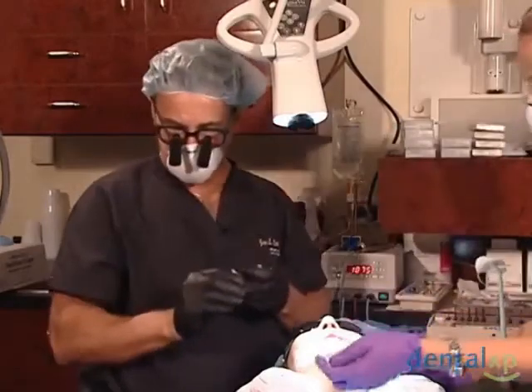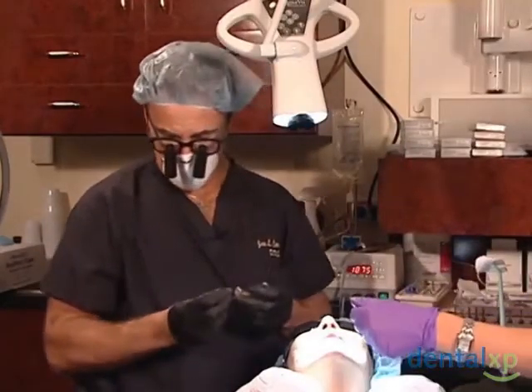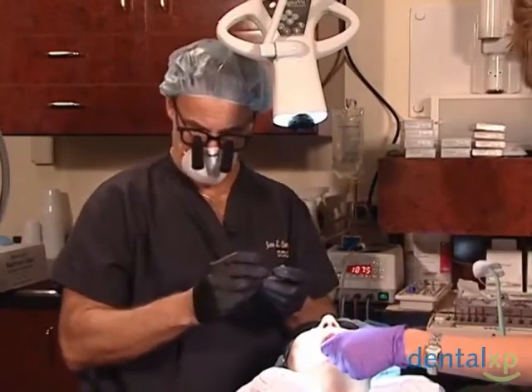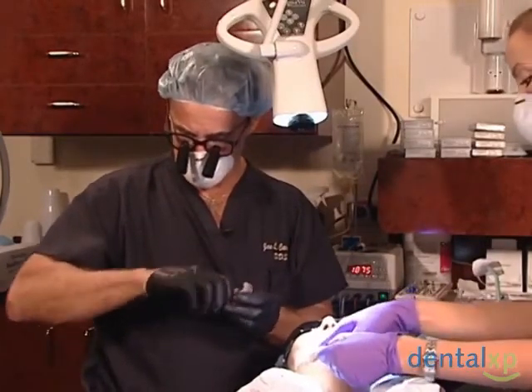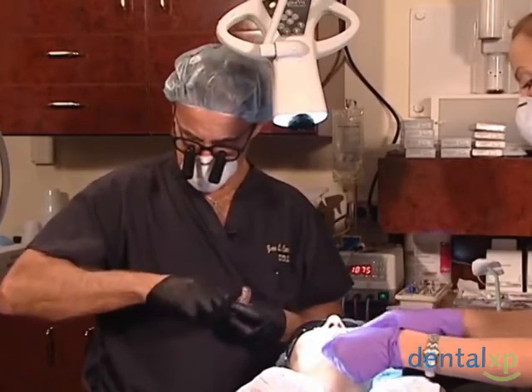The neat thing is that they've even labeled a 2.4 insert tool, which makes it easy for you, if you've never used this system, to use the proper tool and not get frustrated because you have to go through a range. The system is built for placing just about any implant that you so desire.